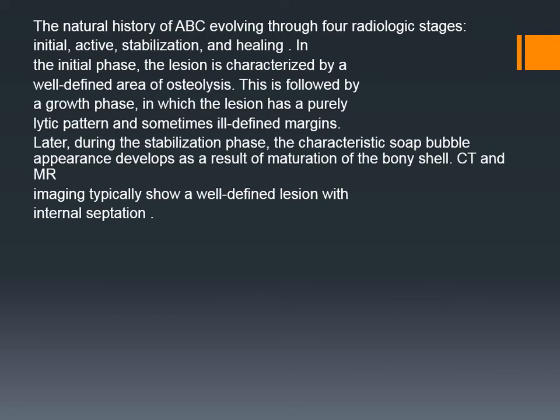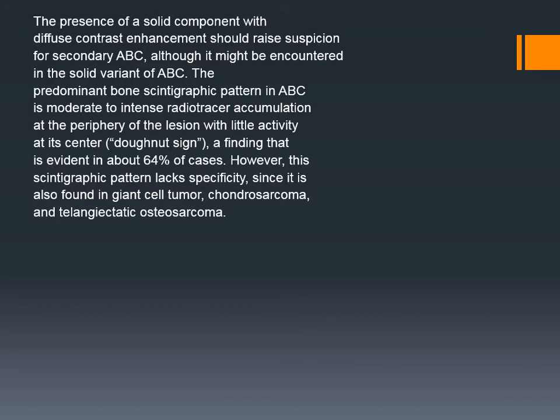CT and MR imaging typically show a well-defined lesion with internal septation. The presence of a solid component with diffuse contrast enhancement should raise suspicion of secondary aneurysmal bone cyst, although it might be encountered in the solid variant of aneurysmal bone cyst. Next, bone scintigraphy.